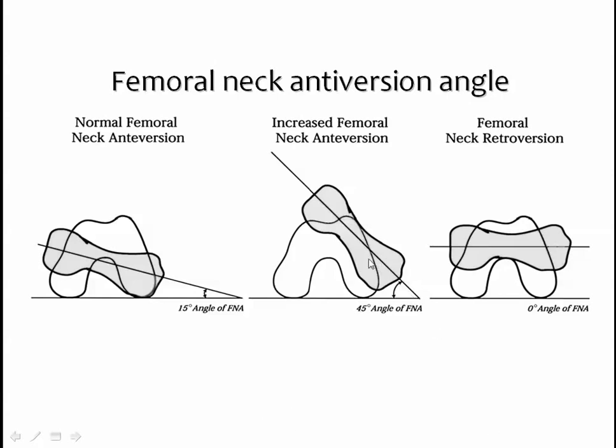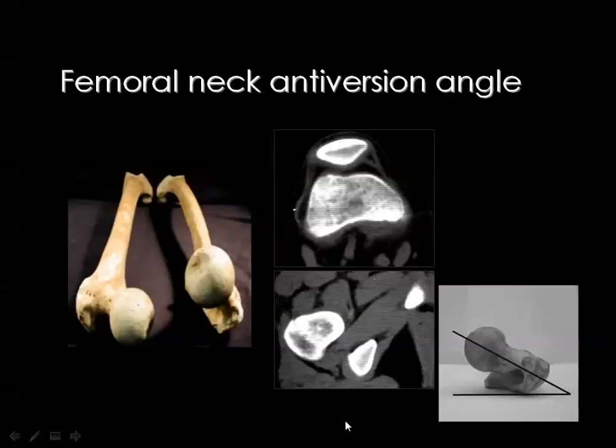If this angle is increased, then you got a femoral neck anteversion. If there is no angle at all, then you get femoral neck retroversion.